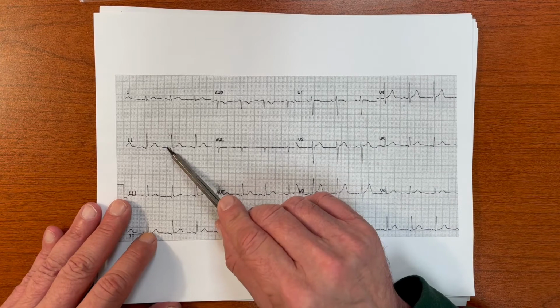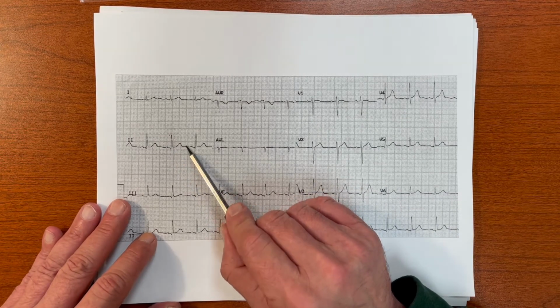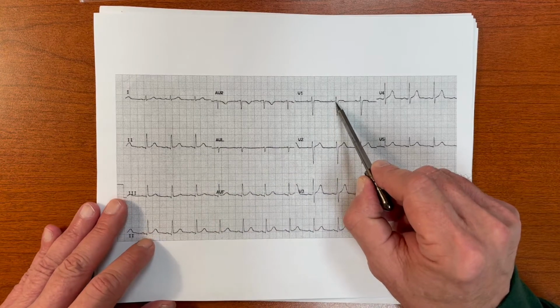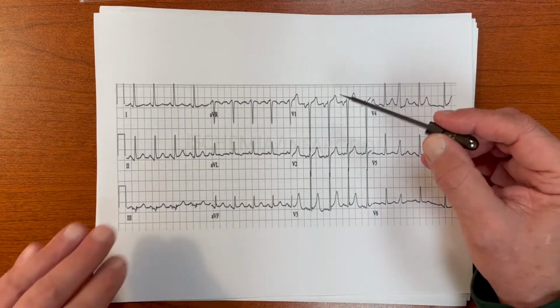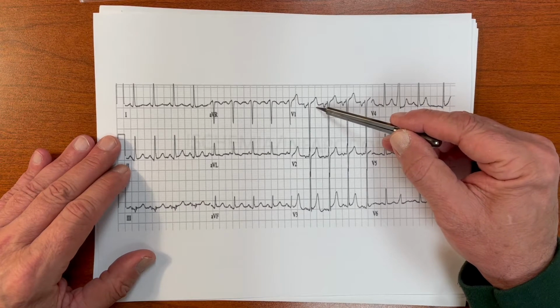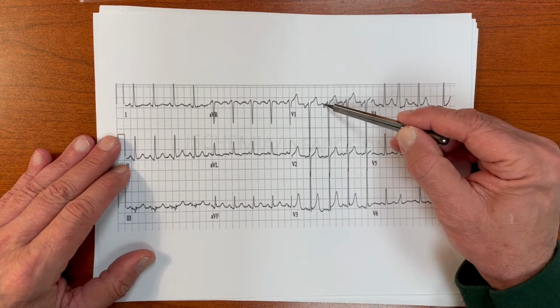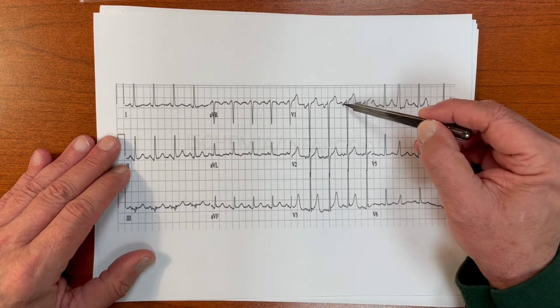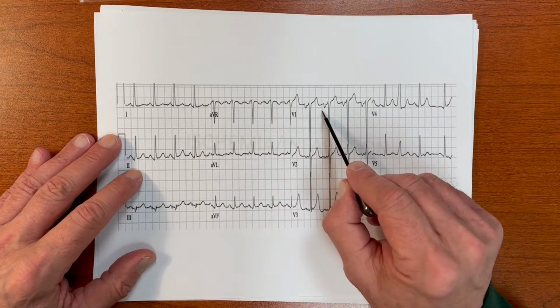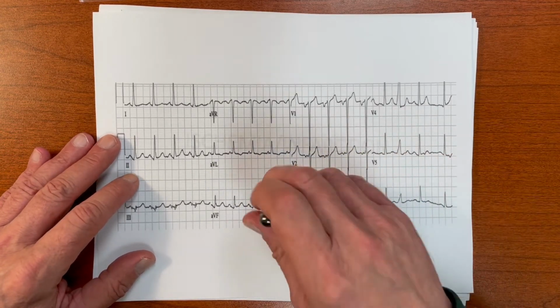That's what a P wave looks like in 2. Notice it's not wide. It's not even maybe a small box wide. Not negative at all. And notice on this EKG, here's a large box. So that's a small box. This is like 2 or 3 small boxes wide and pointing down. Okay? You don't have to have both. You can have just one of them. So that's left atrial enlargement.